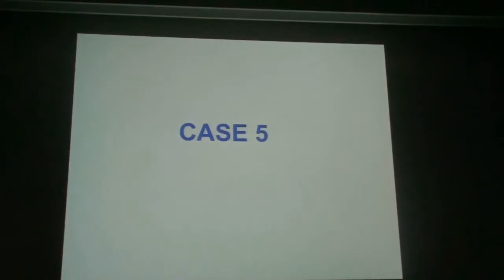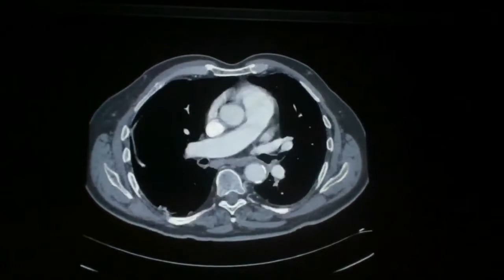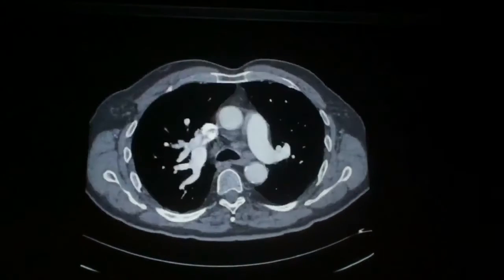So this is my case number 5 that we just saw, so you know everything about it now. And it is so obvious that sometimes, just to show you, I played with the color yesterday.